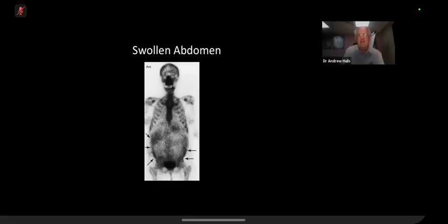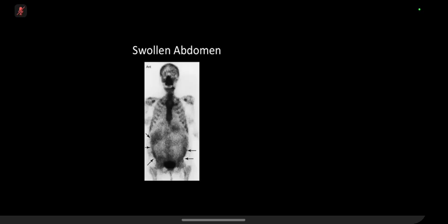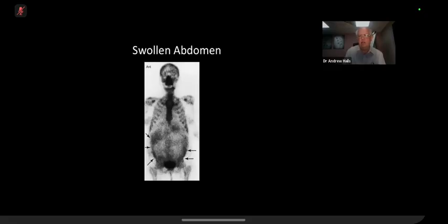So going by the same theme as you initially discussed, now this increased uptake in the soft tissue around the abdomen, which is slightly distended, might suggest a malignant ascites in this case, because it's present in the upper quadrant, in the dependent portions in the pelvis, and in the paracolic gutters. Absolutely correct. Yes, that's correct.